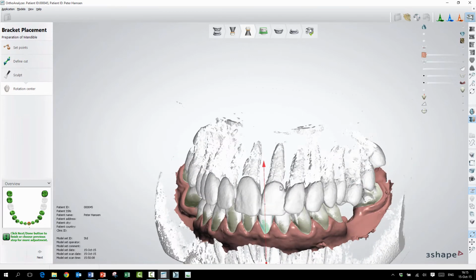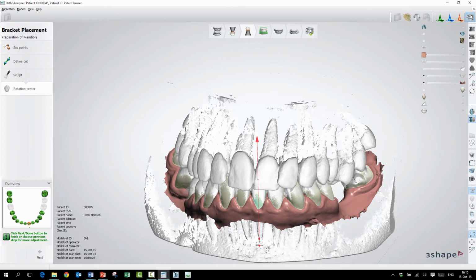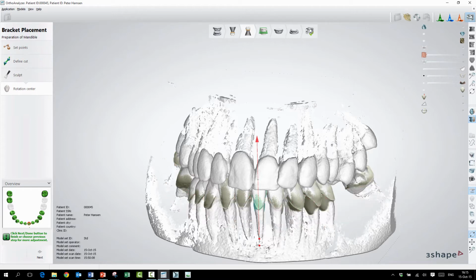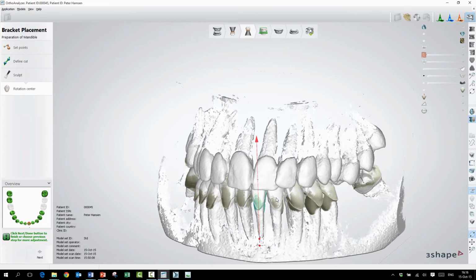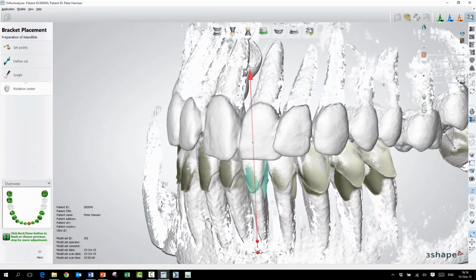And here this is going to be interesting for the bracket placement project, because that allows us to make sure that the long axis of the crown is somehow consistent with the root situation. Right, and we have a separate video on how you align DICOM to your trio scan. Exactly. So I'm not going to do the whole process again, because we focus on the indirect bonding, but just so you know, you can modify it this way.